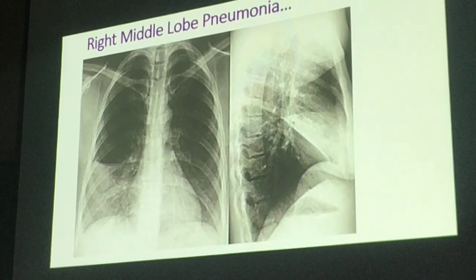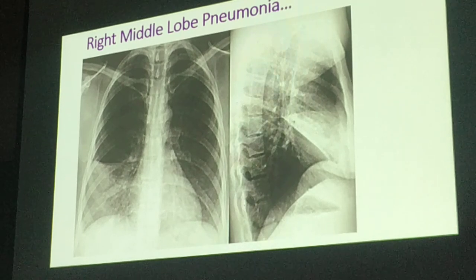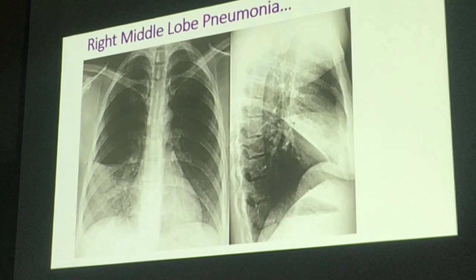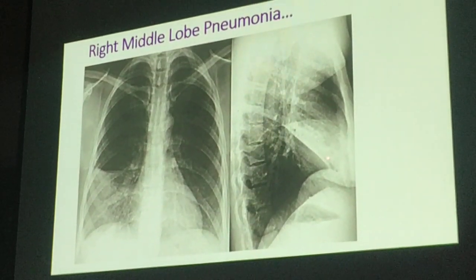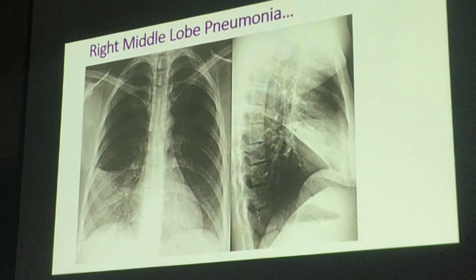Triangular shape, radio-opaque. And you try to see the PA view. The affected lung is on the right side. Okay? But this will guide you to come up with a diagnosis of right middle lobe pneumonia, the lateral view. Okay?